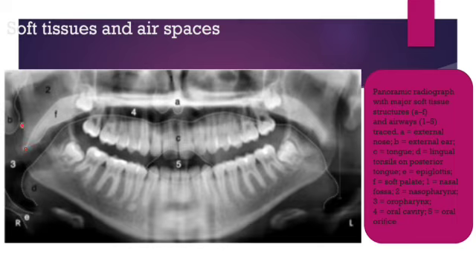And then 4 reflects the oral cavity. So this reflects the oral cavity, and 5 is the oral orifice. So this is the oral orifice, this is the oral cavity, this is the oropharynx, and this is the nasopharynx. So this shadow is the nasopharynx.